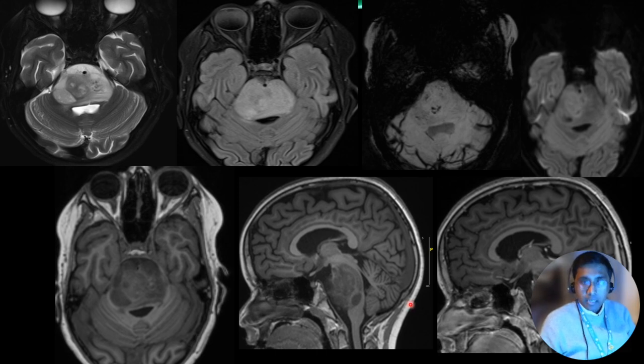So this was again a 7-year-old boy who came with complaints of headache and multiple episodes of vomiting. What we can see here is a diffuse expansion of the pons. As we can see here, there is encasement of the basilar artery, which is again a very characteristic feature of this particular tumor. The mass is quite heterogeneous in T2, and you can see that the margins of the mass, especially the posterior fossa, posterior margins, are not really well defined. There is some extension to the middle cerebellar peduncles, and also there are a few foci of blooming within the mass.